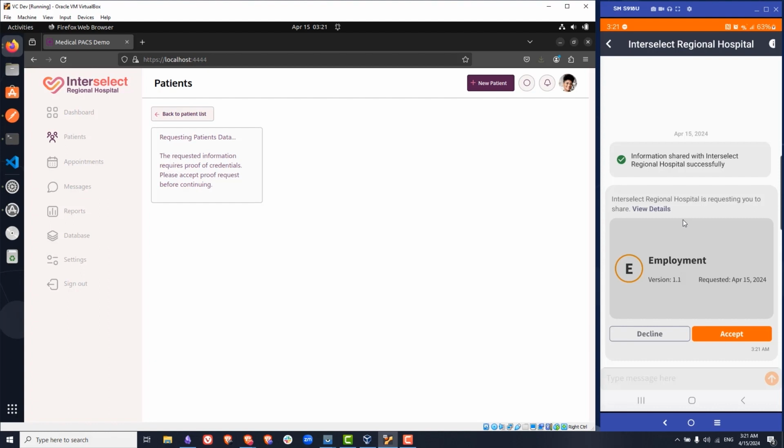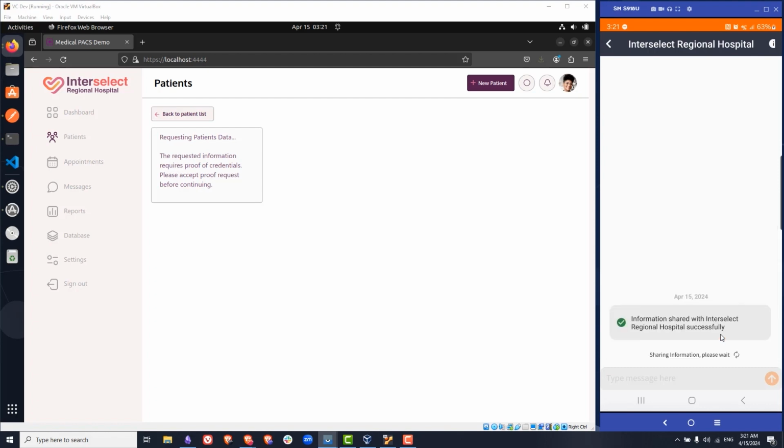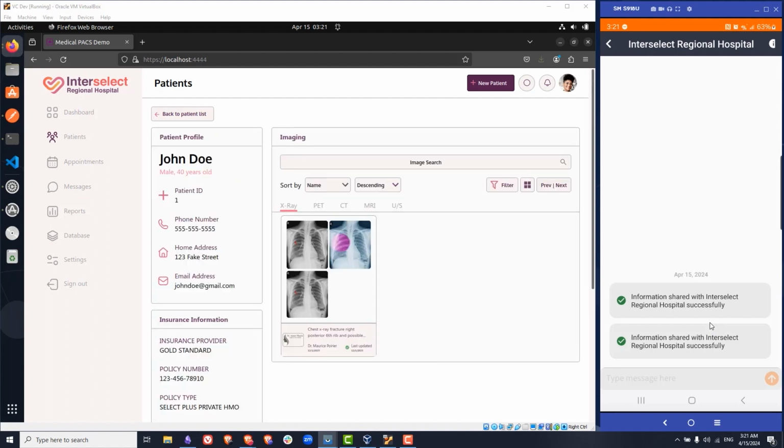Pardon me, the system's asked us for our credential again. We'll go ahead and share it again. This credential request could be cached. It's configurable to be cached for a certain amount of time if you want. So you could say if it's within 5 minutes or 20 minutes or 24 hours, then we won't ask you for your credential again. But you could set it all the way down to 0 so that every time you do a sensitive operation, it'll ask again.